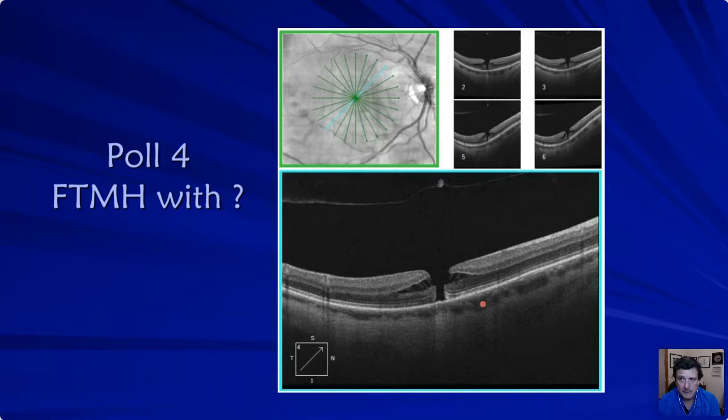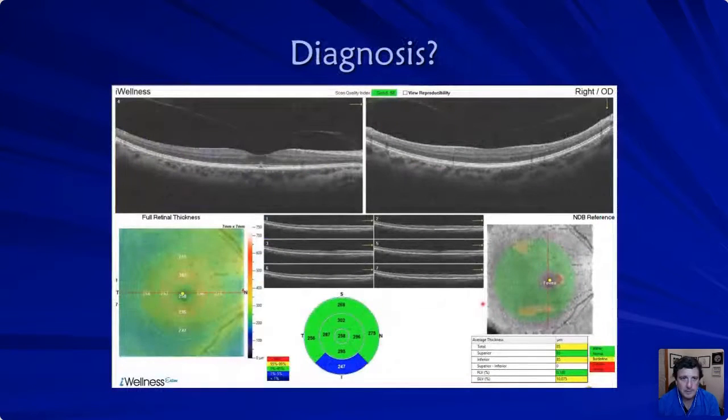So yeah, definitely want to get that over there pretty quickly and get that patient treated for their full thickness macular hole and without vitreomacular traction with a lamellar separation or lamellar hole. So let's take a look at this one. What does everyone see here?